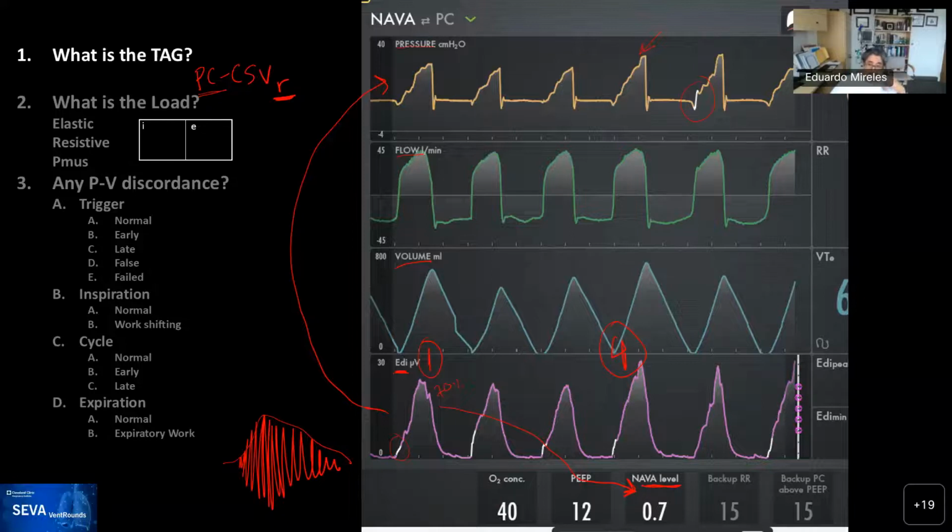Yes, Ari submitted this, and he and I both think that the reason that the fifth breath there was pressure triggered was possibly because the patient was using accessory muscles. You can see that he's making a big effort on inspiration because there's a high, sort of billowed upflow, and he's making expiratory efforts. So it's not unreasonable to suspect that an accessory muscle could have dropped the pressure before the diaphragm signal kicked in. Yeah.